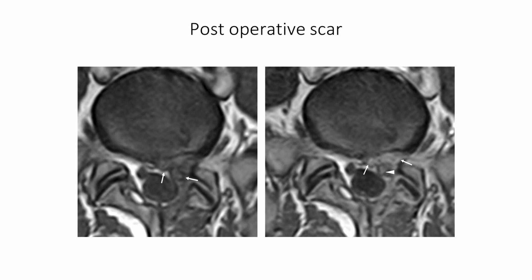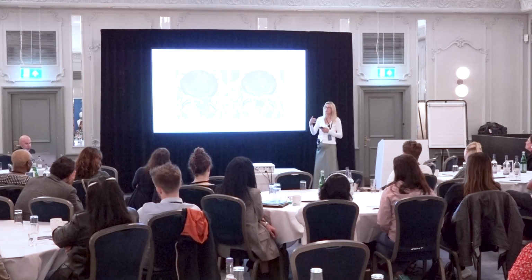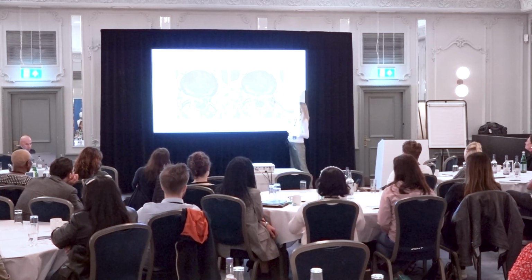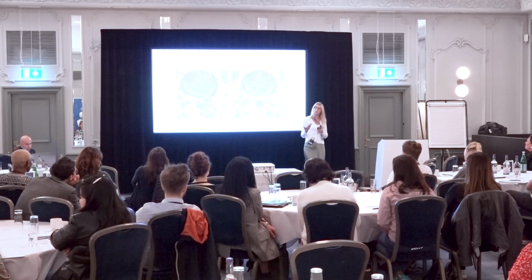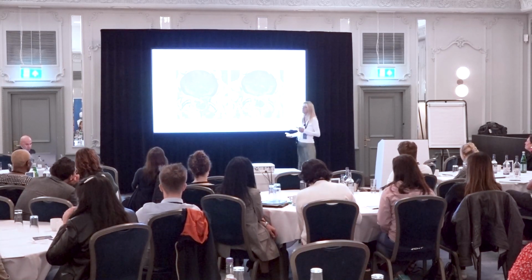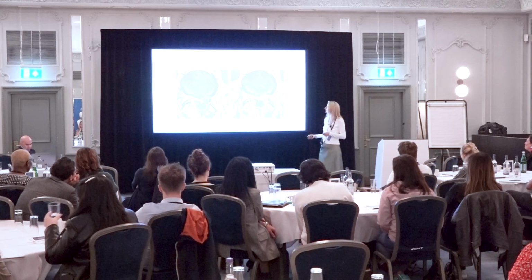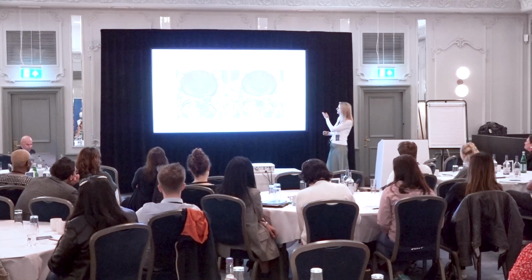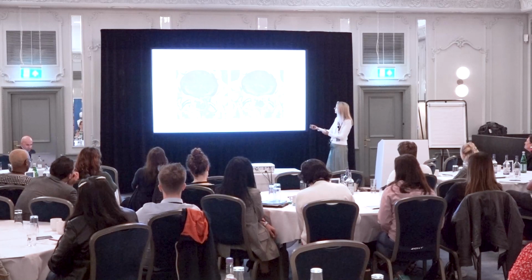This is the nerve root here that's swollen, and it's very common after a previous severe compression for the nerve root to be damaged, and so the nerve root is edematous, a bit swollen, and enhances. So this is scar tissue. We don't worry about the scar tissue because that will settle, but the patient has symptoms because this nerve root is damaged and just a bit delicate at the moment. And usually these patients will settle. So it's reassuring to get a scan like that, and then we'll do another follow-up scan, and usually these ones will resolve.